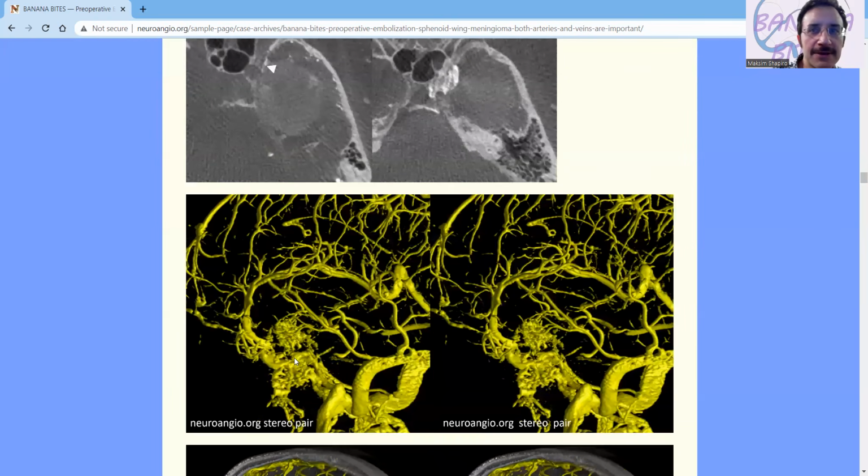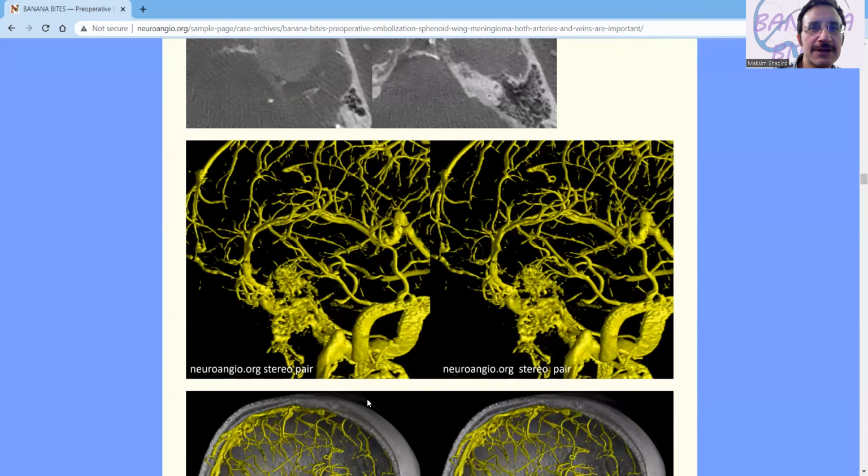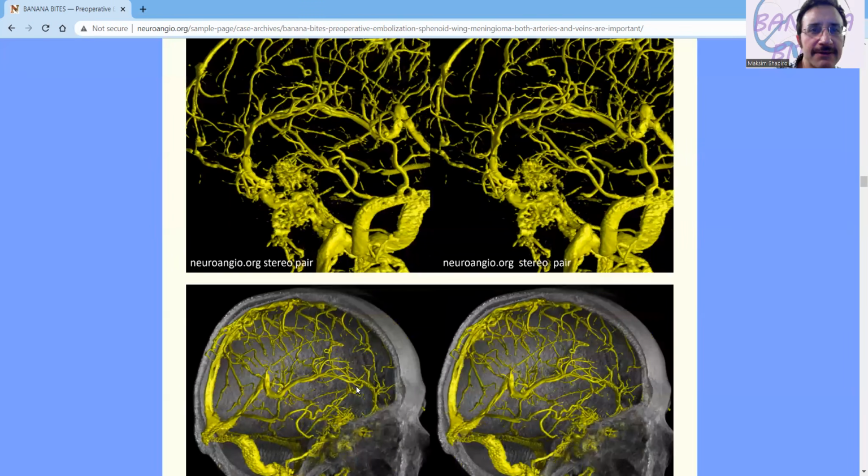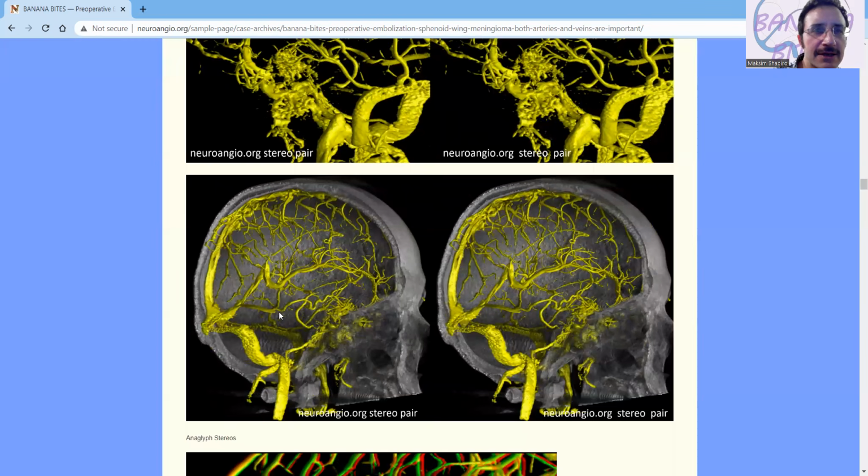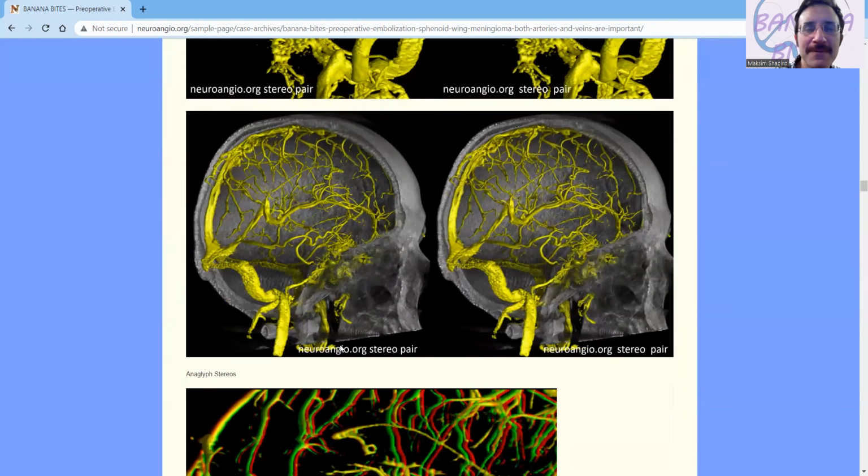Of course, we can make this into our beautiful volume rendered views. This is a stereo pair, by the way. Now, if you see all of that down here, there's some cool variations of the basal vein, and this is like we're seeing medial to lateral. There's some nice variation of the basal vein right here on the other side, dumping into this sinus, right? This is the tentorial sinus that we talk about a lot, and here's a lateral mesencephalic connection. So it's a whole world out there, not principally related to this mass, but still, this is what we see.